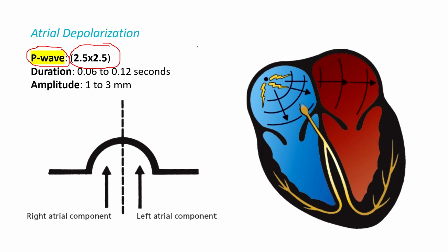In other words, if you have an ECG, the large box, we should have 1, 2, 3, 4, and 5. And here as well, we're going to have 5 again. Sorry for my handwriting, but nevertheless, we just need to understand this.